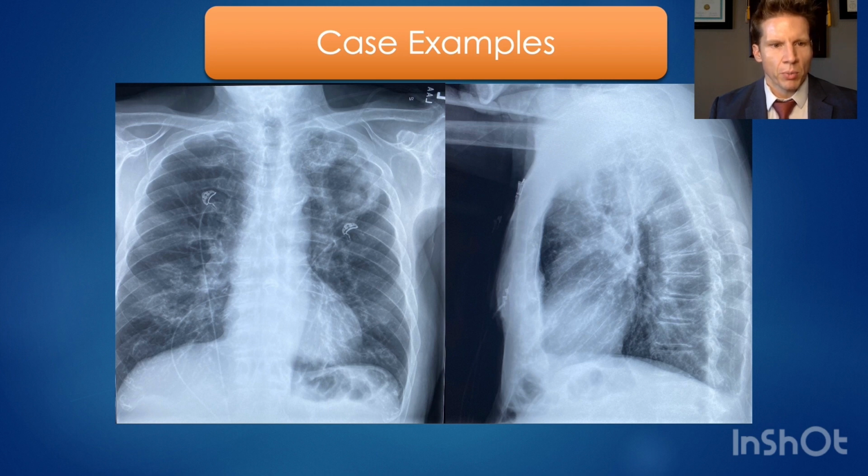There's a mild interstitial prominence bilaterally, which is often seen chronically with a little bit of bronchiectasis or bronchial wall thickening. And then as we interrogate the lungs, part of it's clipped over here, but there's no sign of a pleural effusion. Going all the way up here in a zigzag towards the apex, I don't see anything at the edges of the lungs. On the left, again, I don't see any pleural effusion or pneumothorax.